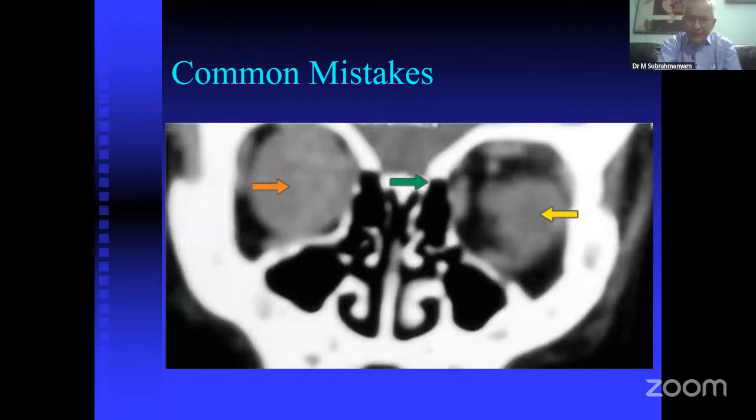The second thing is, here you can see the optic nerve. Temporal to that, you see a cystic cavity. Here is the wall of the cyst, and these are the contents of the cyst. So they feel that it is a cystic lesion of the orbit. But to be honest with you, this is the optic nerve, and this is the posterior most part of the eyeball itself, right?